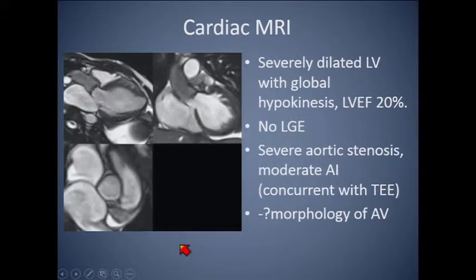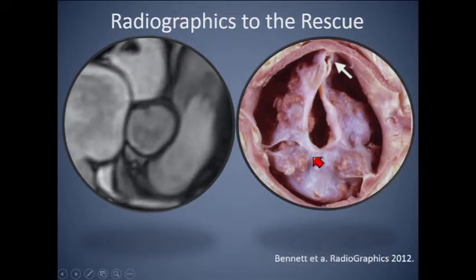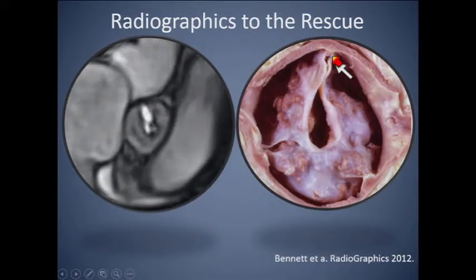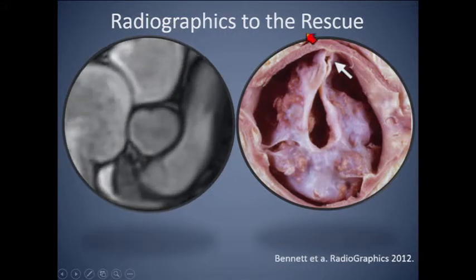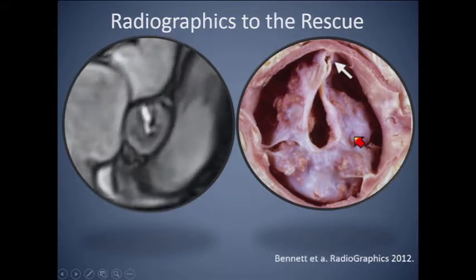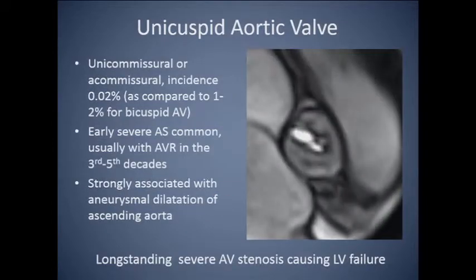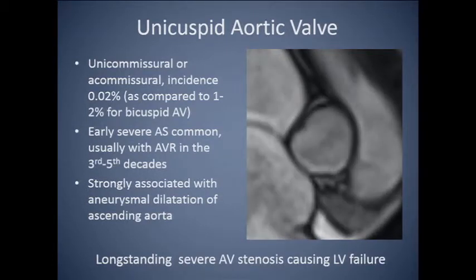And people were arguing this is bicuspid, or we were also arguing we think it's something else. We think it's unicuspid. He actually was getting ready for this talk, and I was like, no, he looks like a unicusp. He looks better than the picture they have in Radiographics of the valve that goes with this. This is our guy versus the Radiographics thing. So they have a single commissure. They have this kind of horseshoe-shaped, just soft tissue. So the poor cath fellow presented him in cath conference and was kind of eaten alive by the pediatric guy. But we stood fast, and we told the surgeon, just give us pictures, so he did.